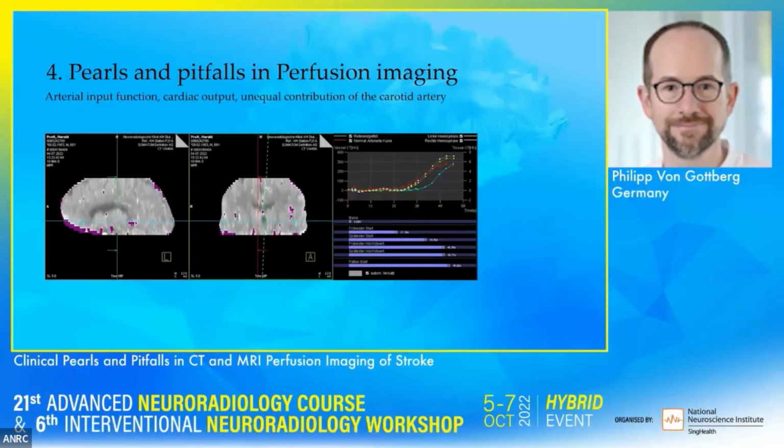Threshold means that a vessel segment is identified as a vessel segment, and others are skipped, so it needs to be a certain level of concentration until a part of the brain is considered a vessel. And if there's too much noise in the image, there will be too many false parts of the tissue considered as vessel, which will then create this distortion in the image.